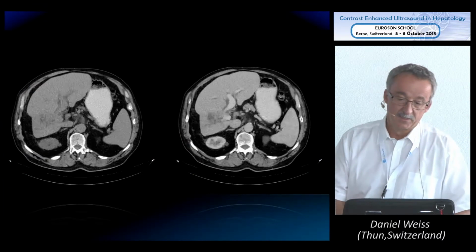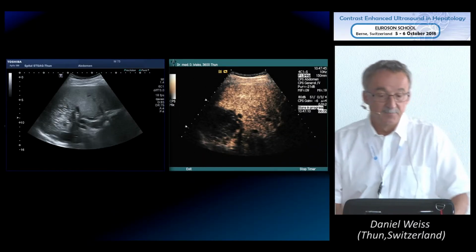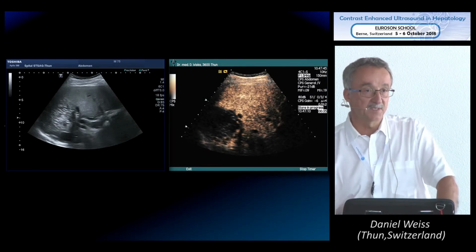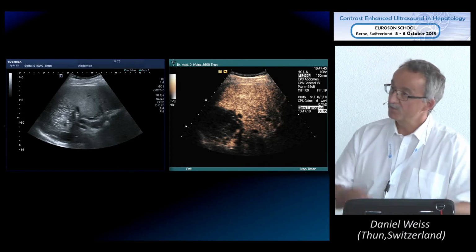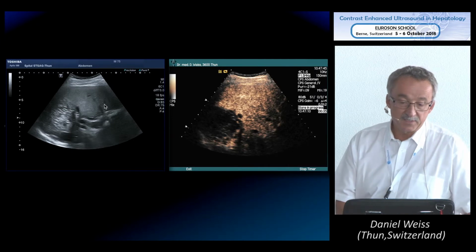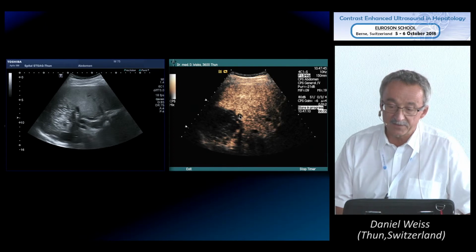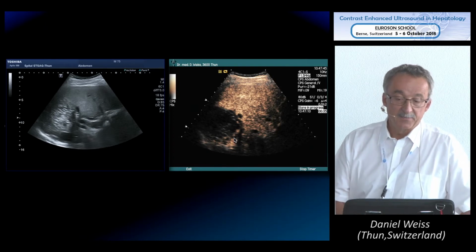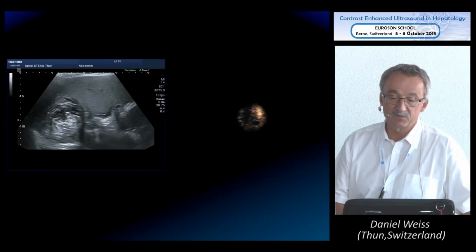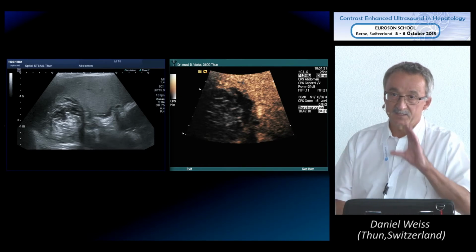So this is the picture of the CT scan, and this is another patient which has been sent to me for biopsy. Tumor in the liver, and I should do a biopsy, and I thought this is not a normal tumor in the liver. And again, if you look at these margins, you have to say, before I do a biopsy, I want to have a serology. And the serology was positive, and I did not do this biopsy.